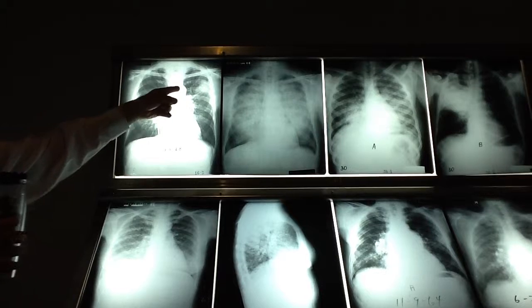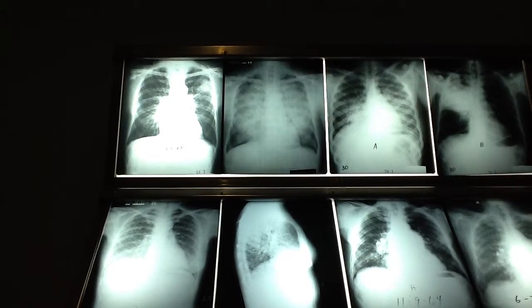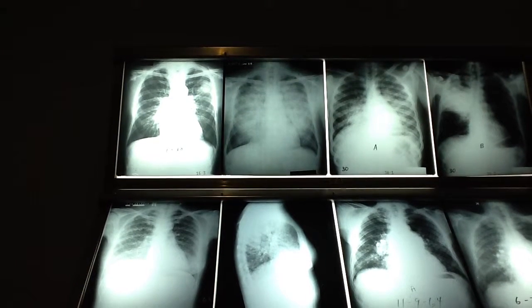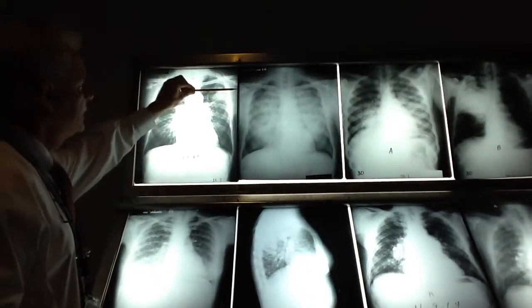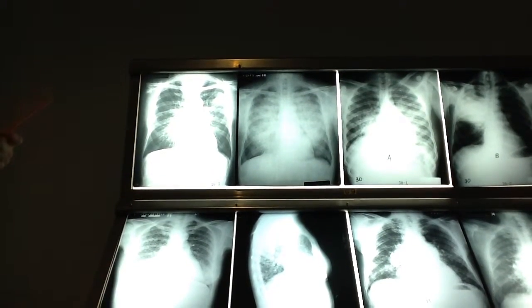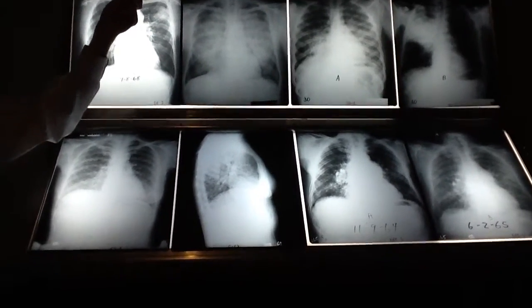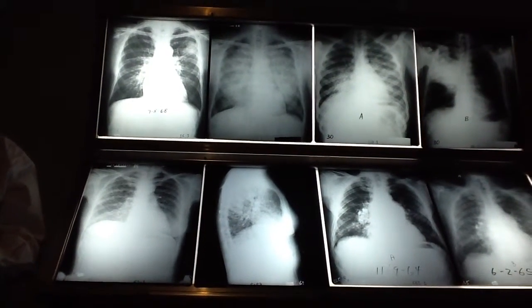So this is a fuzzy border, and is that subsegmental, segmental, lobar, bigger than lobe? Segmental. Okay. Let's say it's in the anterior segment, number 2, LUL, left upper lobe. That segment goes from here to here, and from here to here. So it's the whole entire segment? Because segmental means it's got to be the whole segment. So it's subsegmental, isn't it? It's less than the whole segment. And without a lateral, we don't even exactly know where that is. It could be in 2, could be 1, 3, could even be in 6, because 6 is up there.